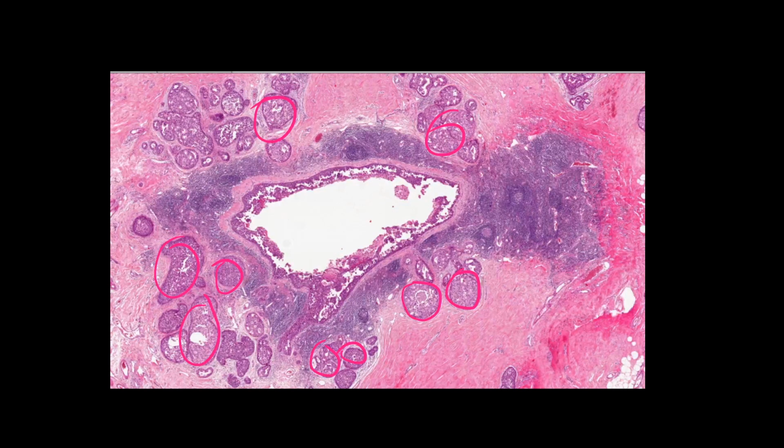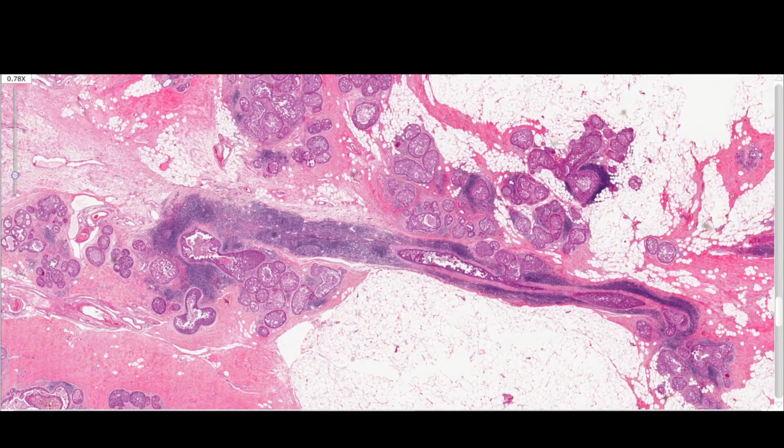What is coming is really the most interesting in this presentation. Look at that long duct with no associated TDLUs. This is really a duct. And the preparations slice the duct in a way that first you see the periductal thick layer of lymphocytes. The red color outlines the cancer. The yellow, the periductal desmoplastic reaction. But then the blue color outlines the lymphocytic infiltration.